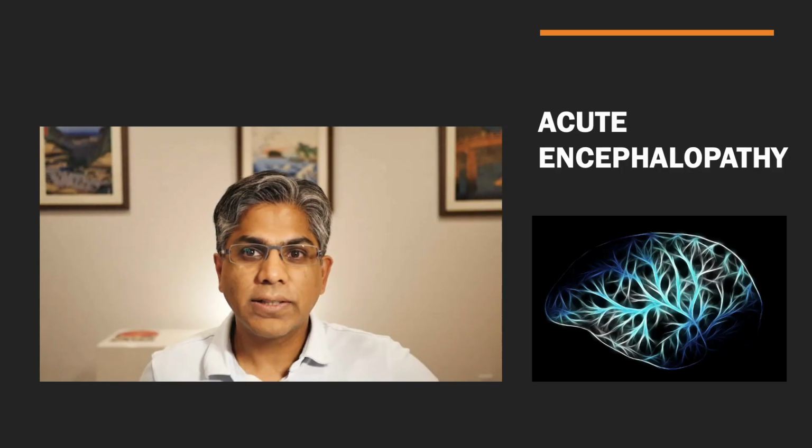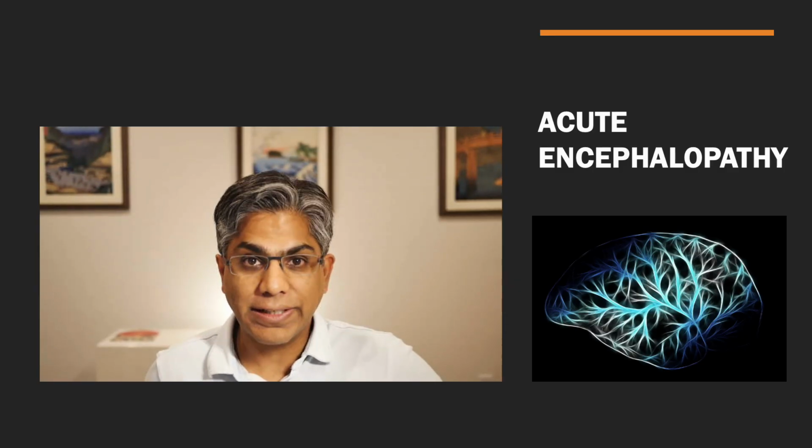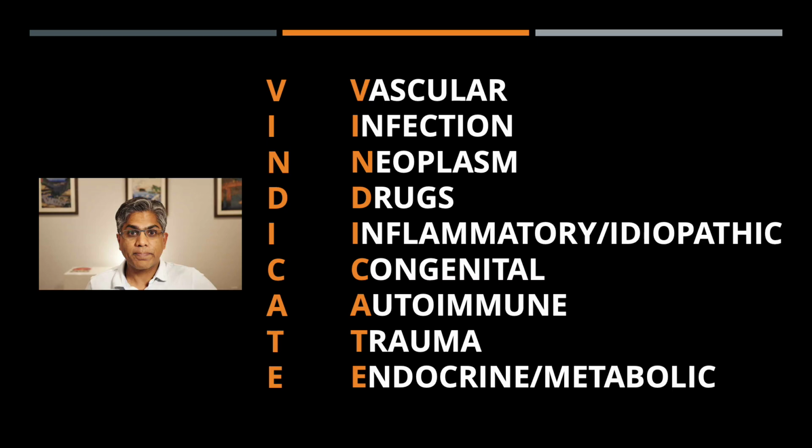Let's think about acute encephalopathy. These are patients who are quite sick. You'll see them overnight in the ER and on inpatient scans. And we're going to look at it in three different image patterns. We're going to look at focal patterns, leptomeningeal spread, and then more diffuse patterns. And we're going to focus mostly on diseases that are not stroke.